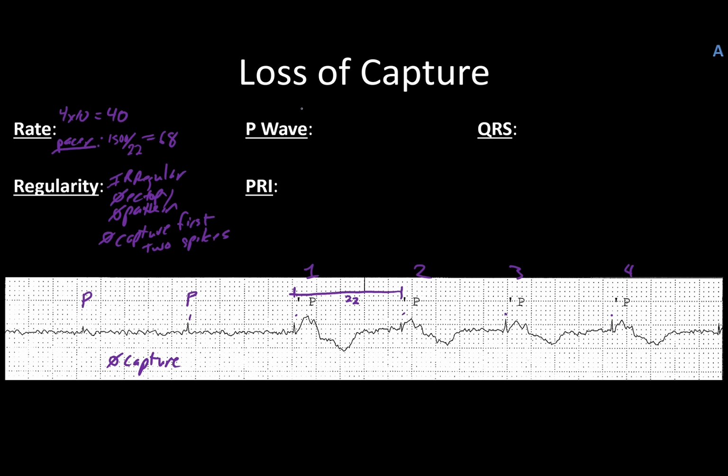P waves, native. I'm hesitant to call it F waves because it's just so jumbly throughout, so you could question if that's the case. But I definitely have artifact for sure. And in either case, it doesn't change much of what's going on.